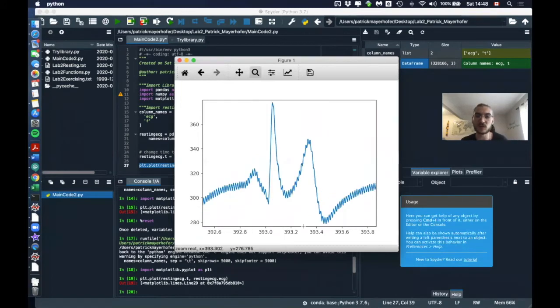Here is something else to mention. As we have talked about in the lab manual, in this data we have this super high frequency noise. This frequency is probably at around 60 Hertz, because I guess my power was plugged into the power of the house, and the AC power line in North America works with 60 Hertz. So that's why, if your computer is plugged in, you might actually get this noise. We talked about this a little bit in the video before, where we collected the data.